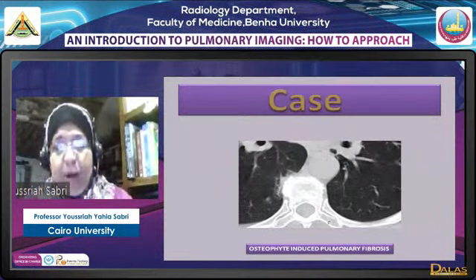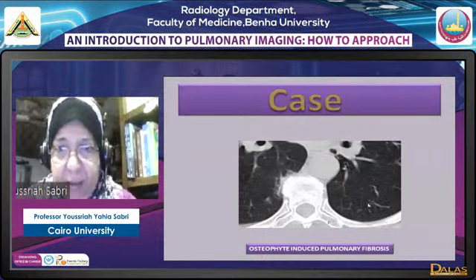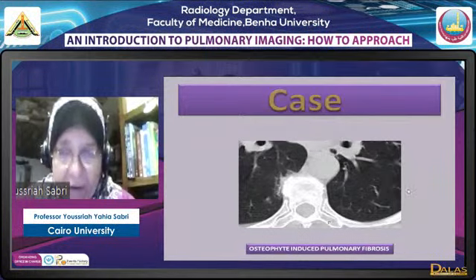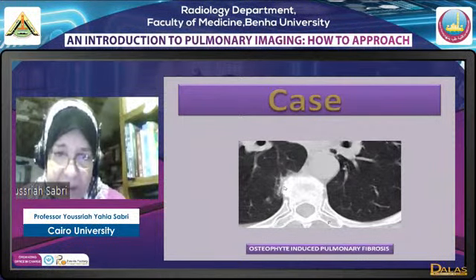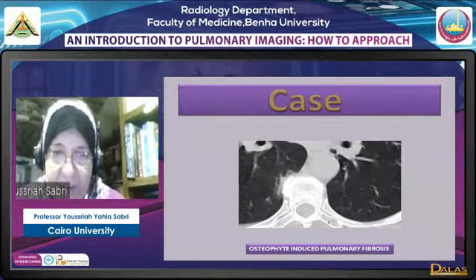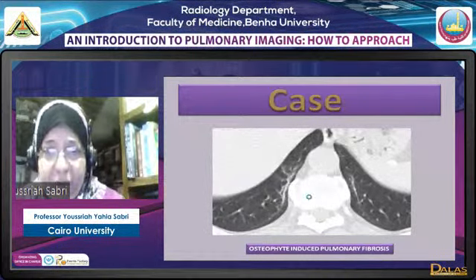Now, this osteophyte-induced pulmonary fibrosis we have met a lot lately, and many people get mixed up in cases of diagnosing COVID. We see here this ground glass opacification or reticulation related actually to the osteophyte. So it's an osteophyte-induced pulmonary fibrosis. It is usually seen on the right side, but sometimes we see it bilaterally. We don't mix it up with COVID-19 fibrosis.